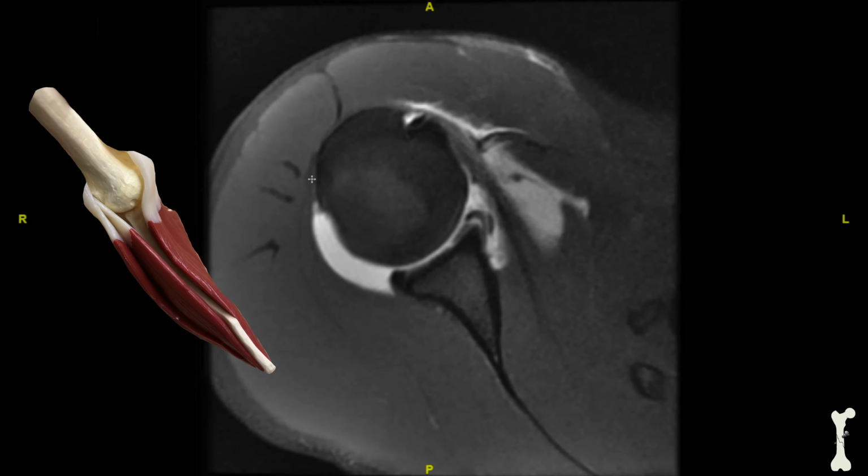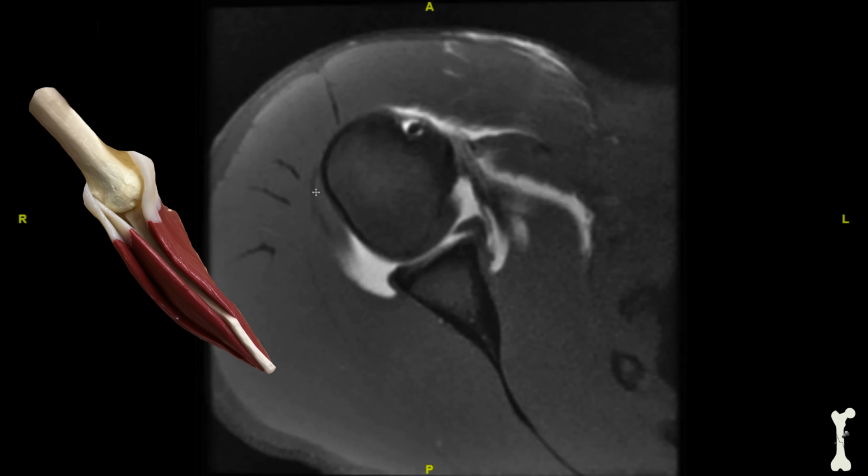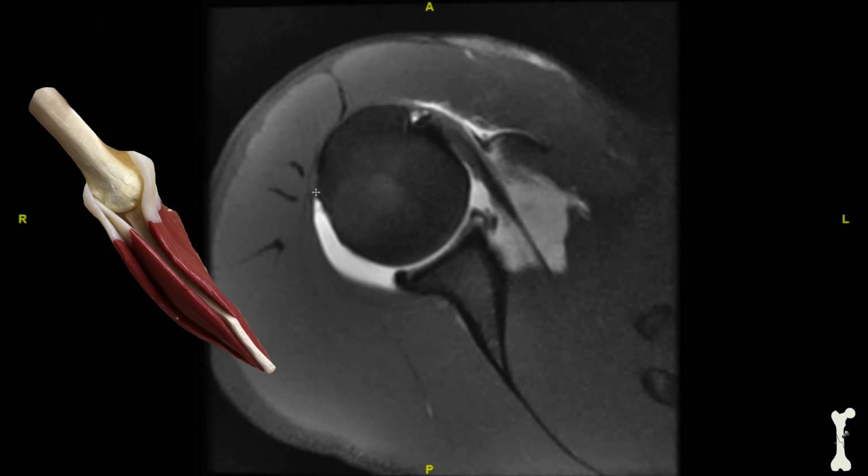And in the back of the shoulder, it's a little hard to see, but you see another gray muscle in this area. And this extends out towards the outer part of the shoulder, and then this also attaches to the ball part of the socket. And this is probably the infraspinatus or the teres minor, which are some of the muscles towards the back of the shoulder. And you can tell how we have muscles pulling this way and muscles pulling that way. Essentially, we have muscles pulling from the front and from the back, and that helps seat the golf ball on the golf tee and helps provide stability to the shoulder.